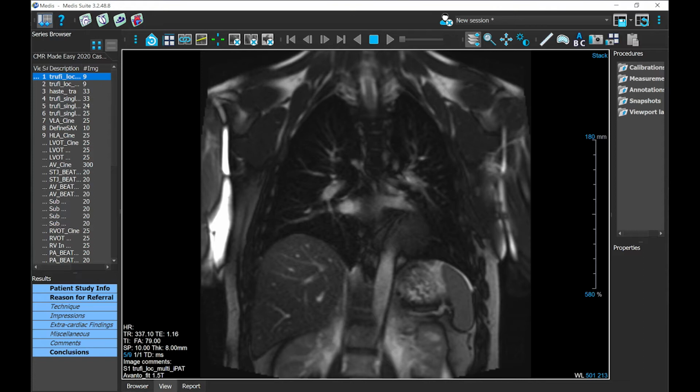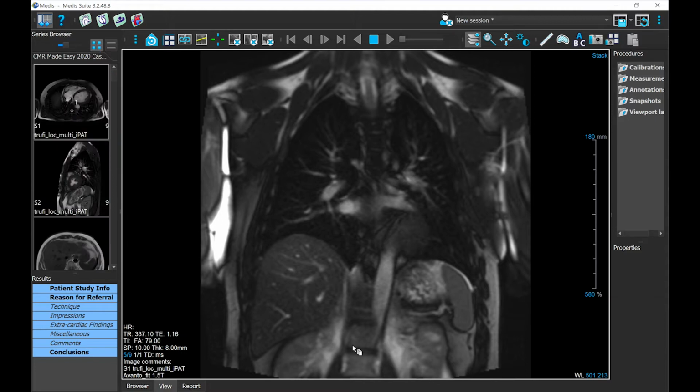In 2001, stenting of residual coarctation was performed. CMR has been requested as part of his routine follow-up care. In the bottom left here is shown the details of the sequence, and also on this panel. And I'm going to now take you through the images acquired.